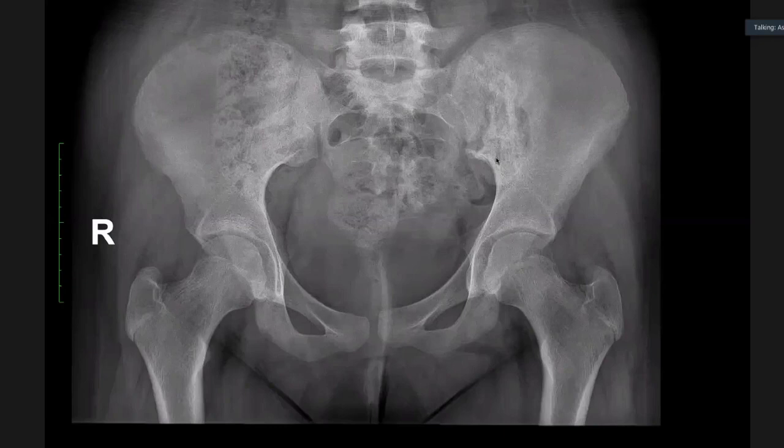Is there any abnormality of the sacrum? Sir, I'm not sure. I don't think so. Yeah, okay, fair enough. You're not sure, but it doesn't look like it's a bit dissimilar, isn't it? The main abnormality is on the iliac side of the left sacroiliac joint. Yes, sir. All right.